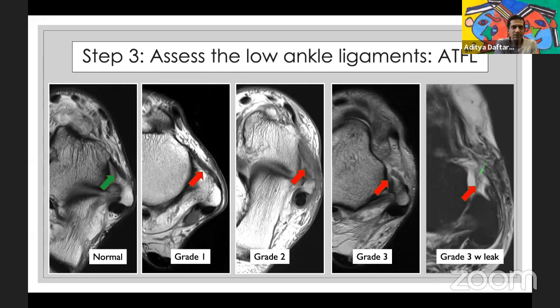When it looks significantly thinner or attenuated, then we tend to go down the path of saying it is poorly remodeled. And the idea really is that MRI, most imaging, is not a great tool to tell that there is laxity. So when we say it's remodeled, we're just saying that it probably looks like a ligament that's not bang normal, but looks a bit thinner or a little more attenuated than before.